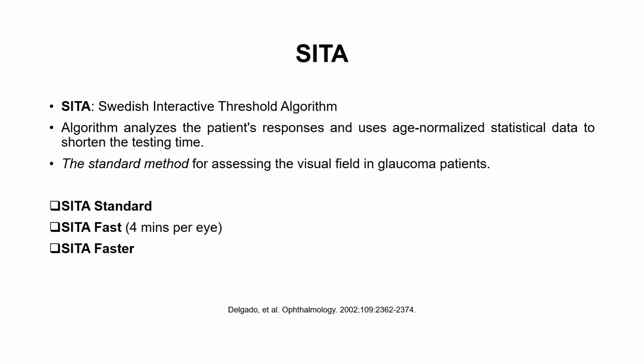and actually some recommendations say that it should only be used for patients with mental and physical limitations preventing them from using other strategies. However, in very, very busy clinics, SITA Fast is very commonly used. Some recommendations say don't use SITA Fast for patients for glaucoma screening or follow-up of progression.